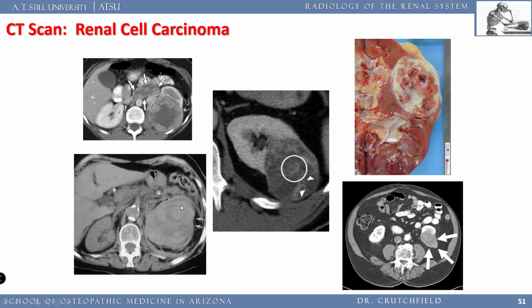And over here, giant tumor in the left kidney, left renal cell carcinoma, and it likes to grow into the inferior vena cava, and it will grow right up into the right atrium. It'll grow right up into it. Nasty player, and it can embolize and break off. You can get pulmonary embolism from kidney tumor. Think about that. Wow.